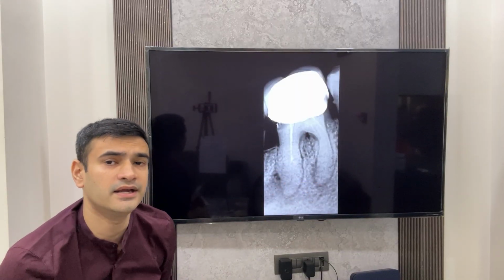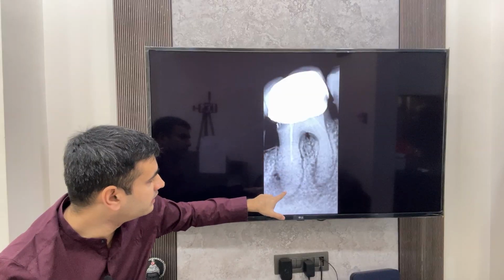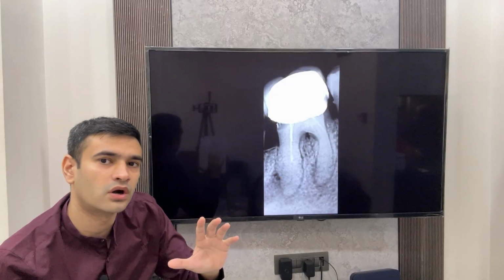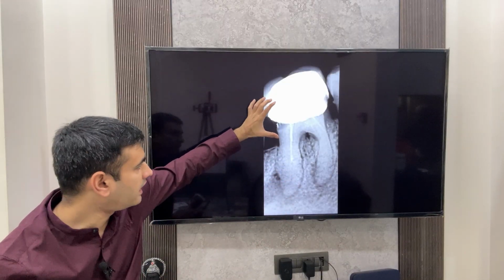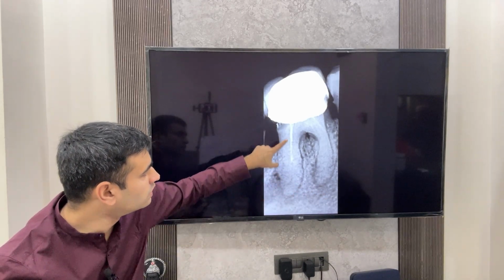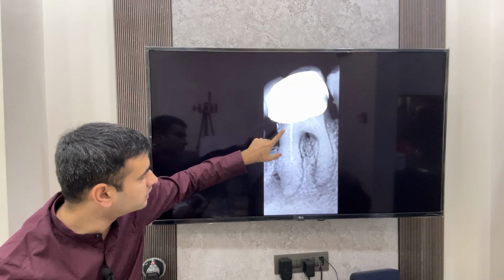Now that dictates a lot of things. For example, if the obturation was done till here, or 1 or 2 mm short, then I can make out that I have to remove the GP and put calcium hydroxide by achieving patency in the canals. So we must look at how far the previous dentist has gone inside the tooth.